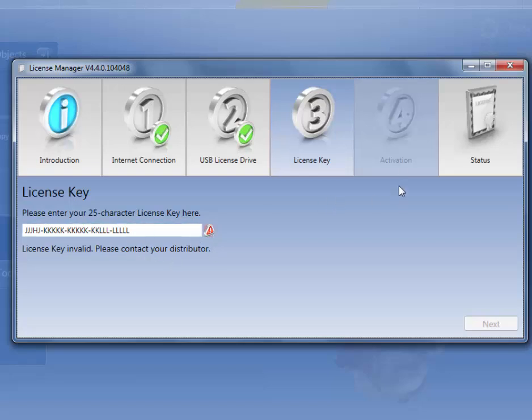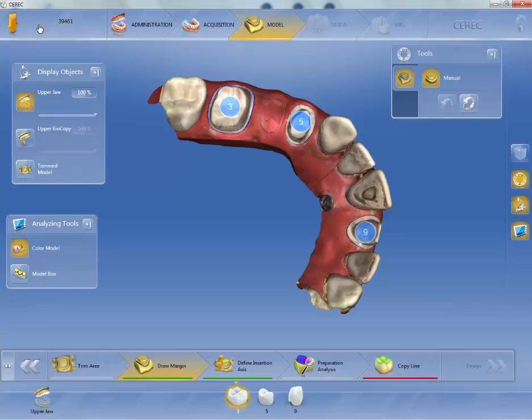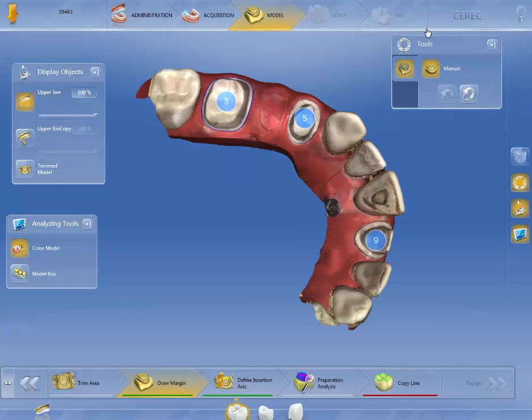Once that is approved, you then just go to this screen where it says activation. This will be highlighted. You'll click on it, and then on the lower corner it'll also say activate, and that's how you're going to activate your license. So I'm going to close that. The drop-down list again. Configurations I'm going to skip for a minute, and I'm going to show you Windows mode.